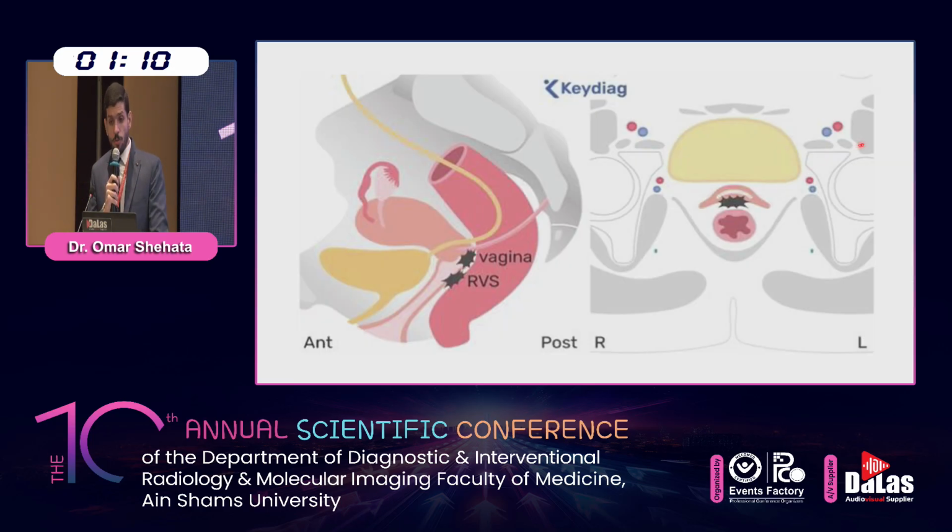The last subdivision of the mediocentral compartment is the posterior vagina and rectovaginal septum, as noted here. Posterior vagina is suspected if there is partial replacement of the posterior vaginal wall, posterior vaginal fornix on T2 image, with a hypointense thickening or a mass behind the inferior posterior wall of the cervix.